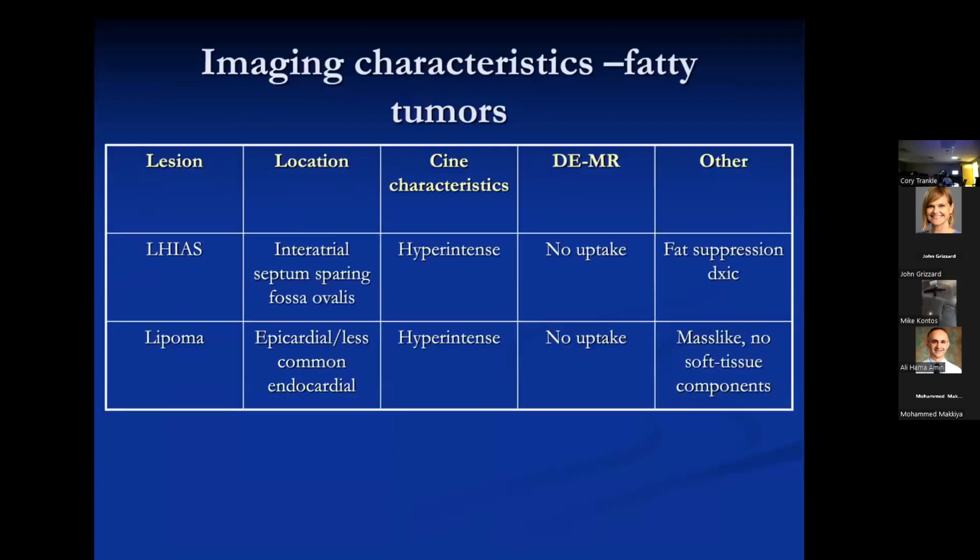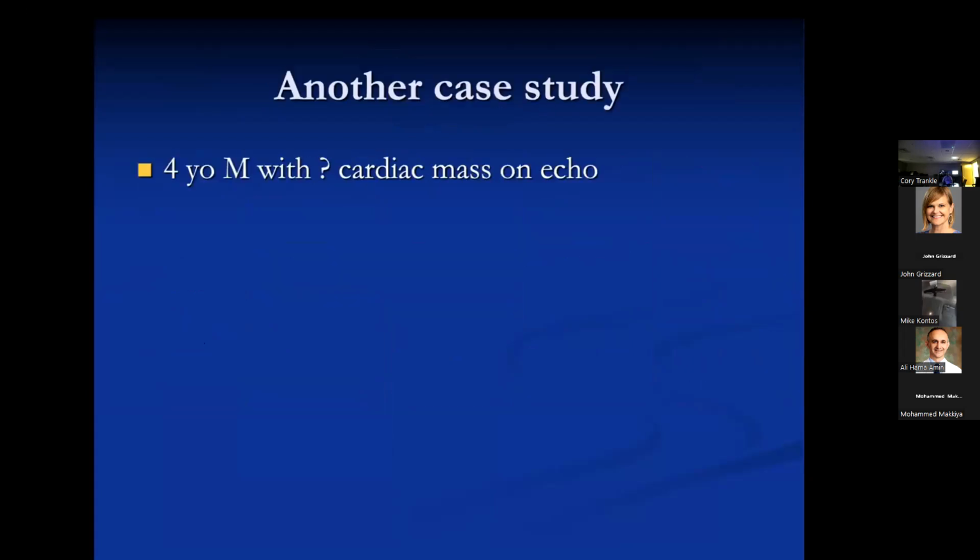Okay. So you have two kind of fatty lesions, quote, tumors. I don't know if they're really tumors. Lipomas are, I guess.